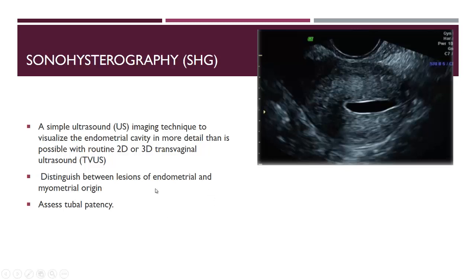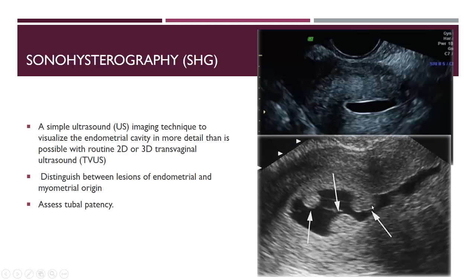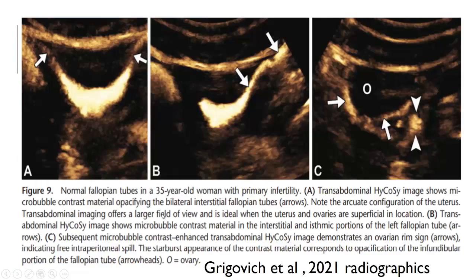In many cases that I showed you, the diseased tube is patent, but it is unhealthy. Also regarding the myometrial and endometrial origin, fibroid or polyp, I think with new machines we can differentiate between polyp and fibroid without the use of sonohysterography. This is a sonohysterography showing multiple polyps, like the case I showed you in the hysterosalpingography. These multiple polyps are better seen. Also in the presence of intrauterine synechia we can detect well. This is another case. There are multiple polyps seen, and also intrauterine synechia.